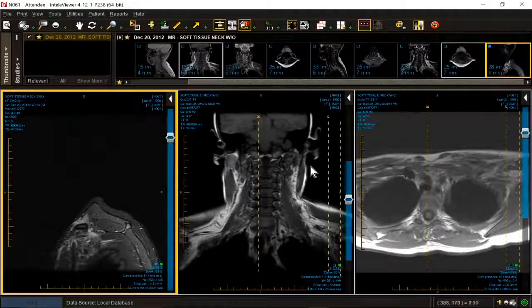This is not a rare entity. You're saying, well, why don't I know about it? It's new. How new? 5 to 7 years old. But it was described and discussed by a great and famous, now retired hematologist, oncologist from the Midwest. So it's real. We go to the jugular foramen.